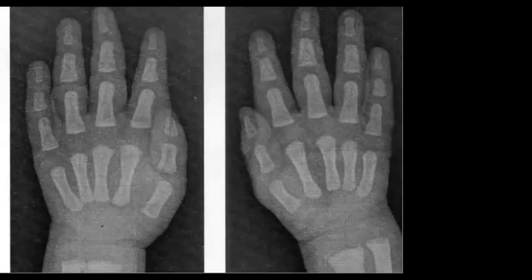You remember that the osteogenesis imperfecta as a differential diagnosis typically takes the long bones, the shaft of the femur, for example, and is associated with minor trauma. So the history is important. And also there is what is called Wormian bones and reduced bone density.